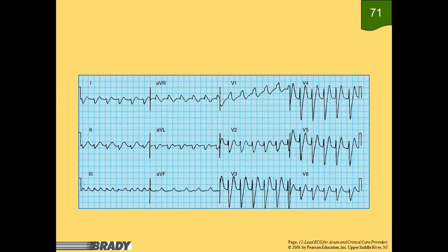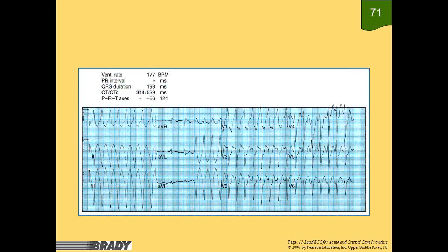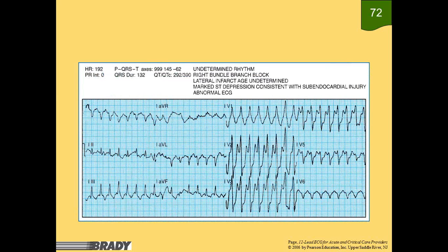Then we're going to look at our peaks, and we've got a smaller left than a right in V1, but that's not really conclusive of anything. And then let's look at V6, and we've got negative in V6. So that is going to give us our VTach. That is conclusive of VTach. So kind of use those rules. Go through here. It's interesting to read the machine diagnosis and then try and put your own to that, that makes some sense. So look at these and see if you can kind of muddle through those.